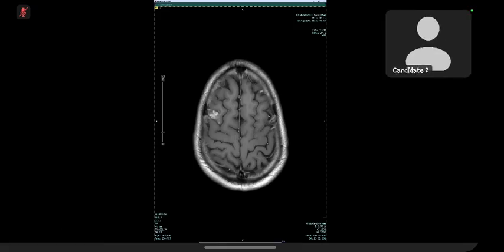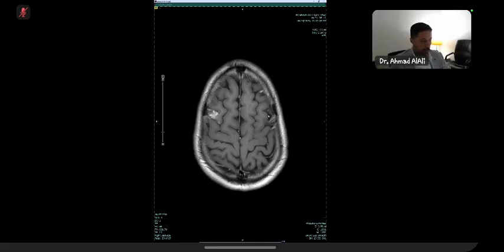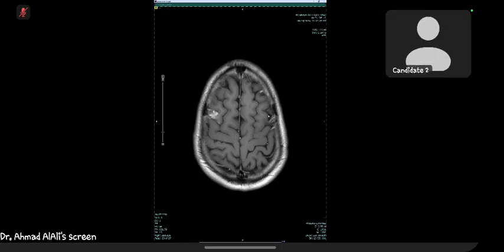There is a possibility that the previously described hyperintense signals on the FLAIR suggest an edema, and this enhancing focus can be the focus of any neoplastic etiology like metastasis, or it can be an area of leptomeningeal enhancement, which is causing the surrounding edema. Right. So what's your main diagnosis and the differential diagnosis here? Keeping in view the post-contrast images, it's likely a metastatic focus.